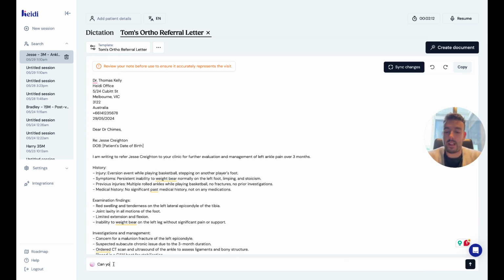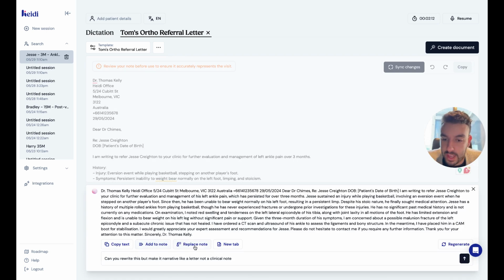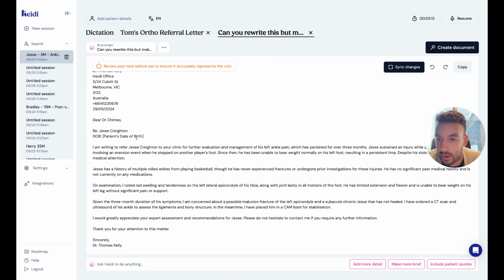So can you rewrite this, but make it narrative like a letter, not a clinical note. And it's going to go ahead and write it again for me. And this time I'm going to add it to a new tab. And so you can see now I've got a more detailed note.